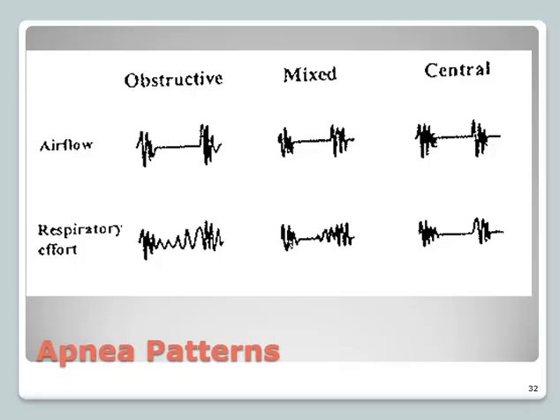What will tend to happen here is in between an event or in between an apnea, throughout the time that the apnea is occurring, your CO2 is rising, rising, rising, rising. As a result, patients or people will start to hyperventilate to blow off that CO2 that accumulated and bring their oxygen level back up. But sometimes there can be an overshoot. They can blow off too much CO2, and that's where you get this little central component. But by the time the CO2 rises back above apneic threshold and it stimulates their breathing, their airway is closed off, and that's where you get this obstructive component.